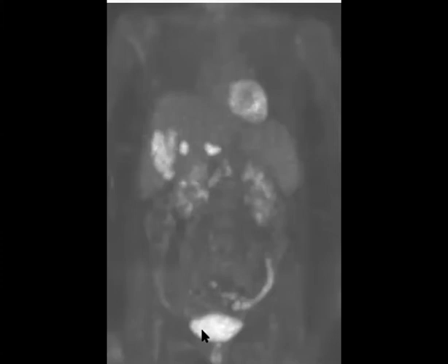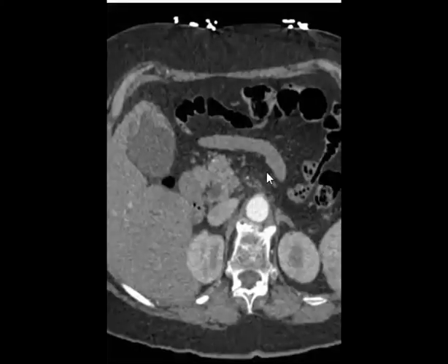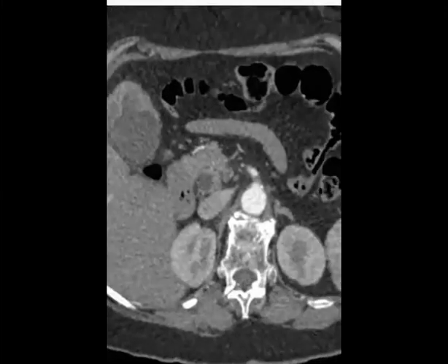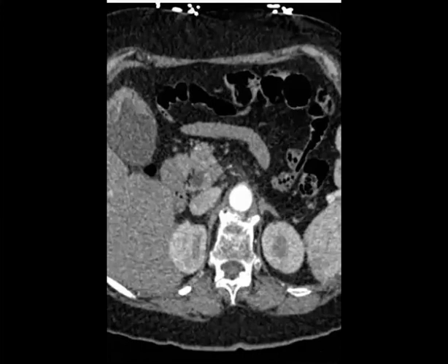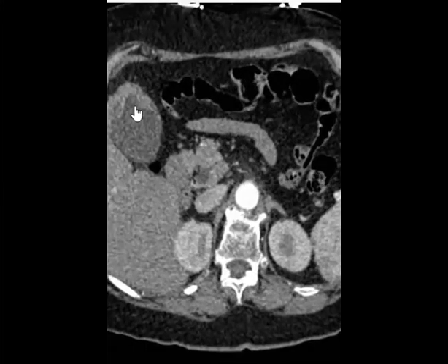See the urinary bladder, we already know from previous sessions that this is normal excretion. And yes, there is high uptake. Also the heart has physiological uptake, but it is very high. But now consider the gallbladder. So now, Nermeen, are you with your differential again or did you change it? Now go to the CT image and tell me what is the most important differential you got after you see the very high uptake of this gallbladder thickening.